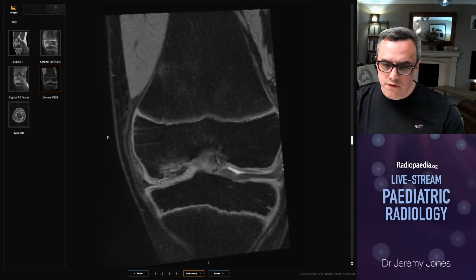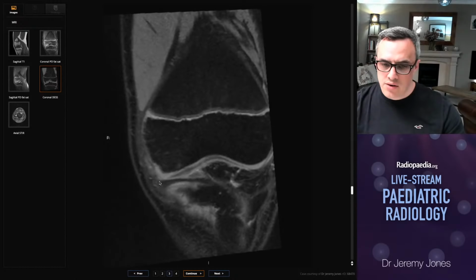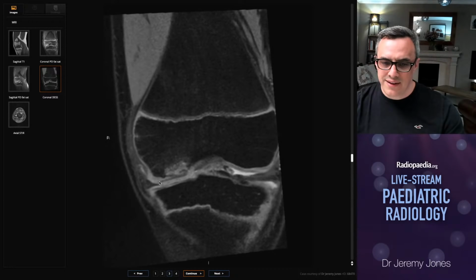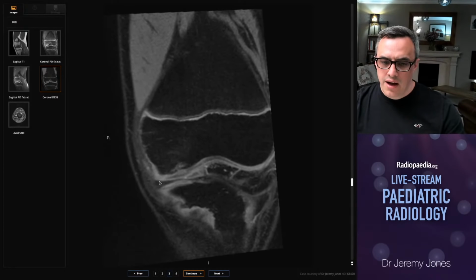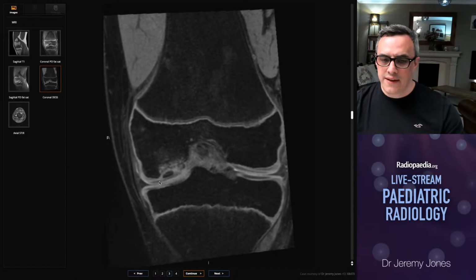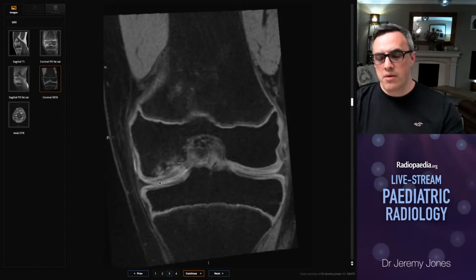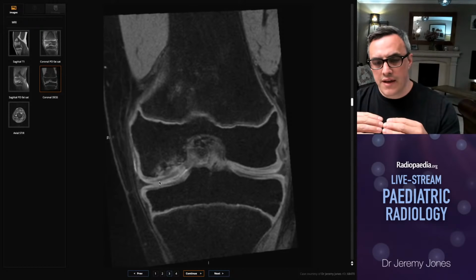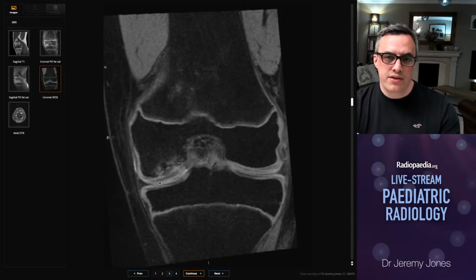And as we follow the cartilage around all the way across the osteochondral defect, we see that it's in continuity, and that's really important. So these lesions, the natural history of them is that they develop. We're not entirely sure why. There may be some genetic predisposition, some repetitive microtrauma, a whole host of other potential etiological factors.